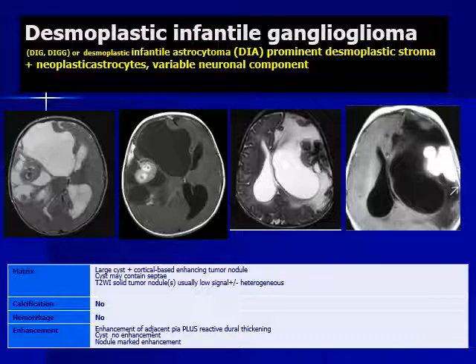It appears like this: lesion, cysts, and nodule. The nodule appears hypointense in T2. Hypointensity in T2 means that it is highly cellular or fibrotic. From our practice in MRI, the things that appear hypointense in T2 are fibrotic. So the name is called desmoplastic, hypointense. And it will smoothly, homogeneously enhance. And as you see, you can see a dural tail here because of it.